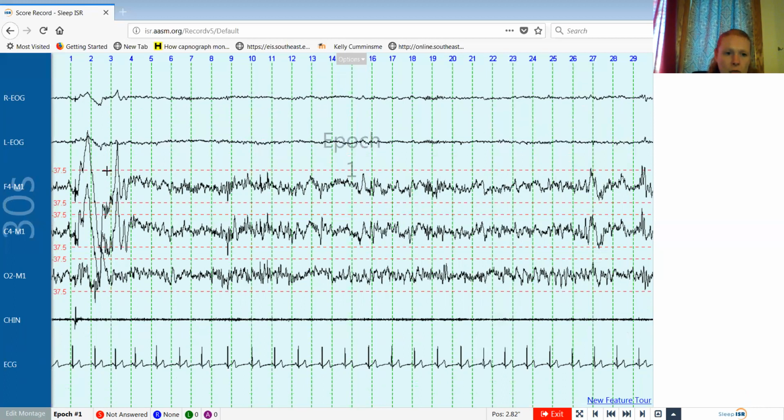It's bigger than that. So technically, this waveform right here is a delta wave. Now, this peak to its peak down here, again, this goes way out of this one, not quite on this one, so it would not qualify as a delta wave. Okay.